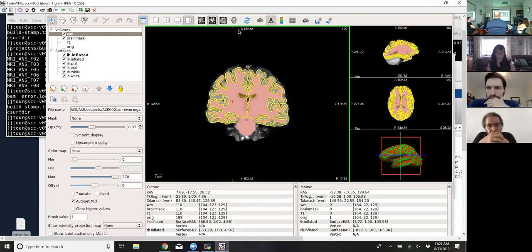I'm guessing also because this is their naming convention, if you're entering different naming files, it wouldn't work in the same way. Exactly. Considering it's their program and their naming convention, if it says inflated, they only show it. Yes, and so they do it by default.